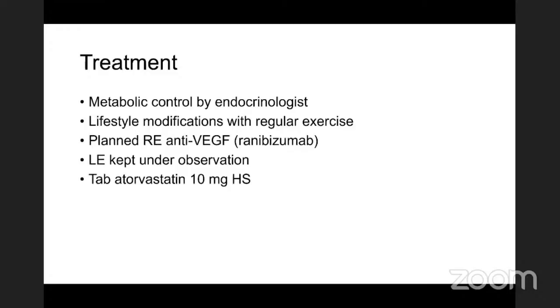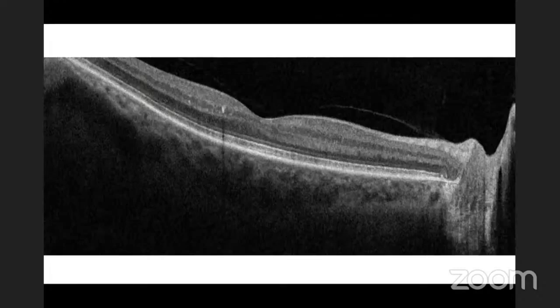And this is the follow-up OCT of this patient, and this patient actually did well. And we can go back and actually see that this patient had intact inner layers and outer layers, and probably this is why this patient actually did well compared to a lot of other patients that we see in our clinics. Thank you very much.